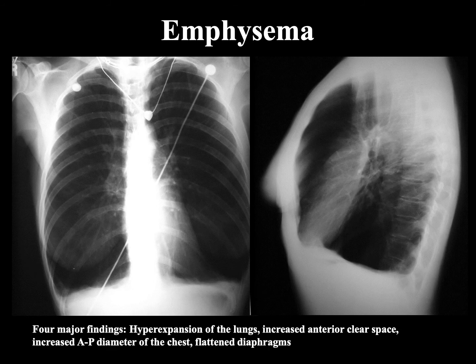Then emphysema. So you don't see much of anything except for dark areas, indicating that this is more of a hyperexpansion of the lungs. See more AP diameter, pretty large space here as the lungs try to expand to get more air. And the diaphragm is fairly flat. In the others you saw this big angle up and over of this portion, and then the liver portion as well. Here it's very, very flat. So these are all signs of emphysema.